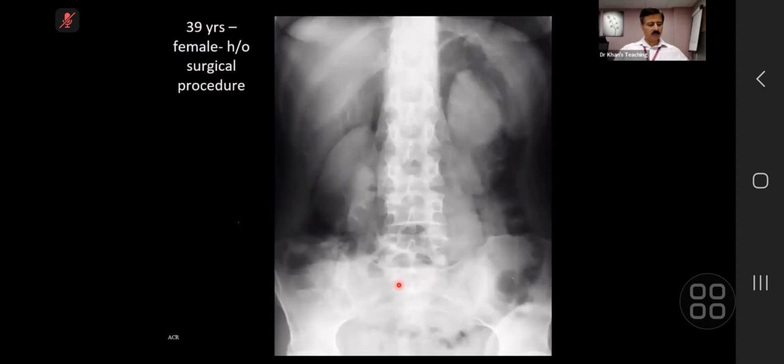Yeah. So the patient has had a surgical procedure. So I'm just wondering what kind of retroperitoneal gas it could be, because the retroperitoneal structures are hollow viscera which are ascending. Why do you say so? My question is more basic. Why do you say that there is retroperitoneal gas? So the learning points are, where do you see retroperitoneal gas? Outlining the psoas, outlining the kidneys.